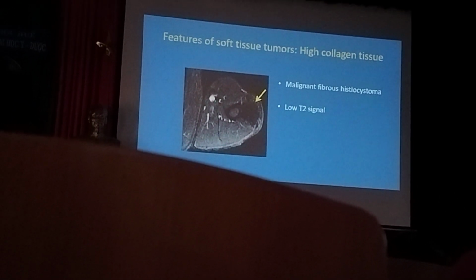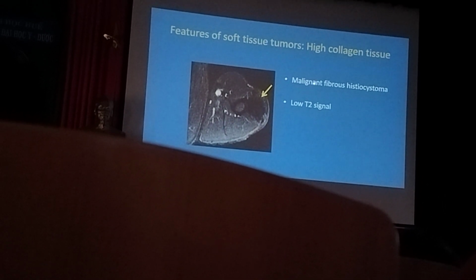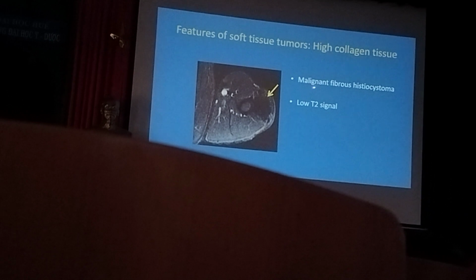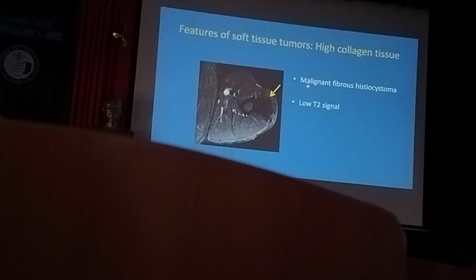Okay, but anyway, this cannot jump to benign lesion, because you can also have fibrous, high collagen tissue, and this one is low signal intensity, but it turned out to be malignant too.